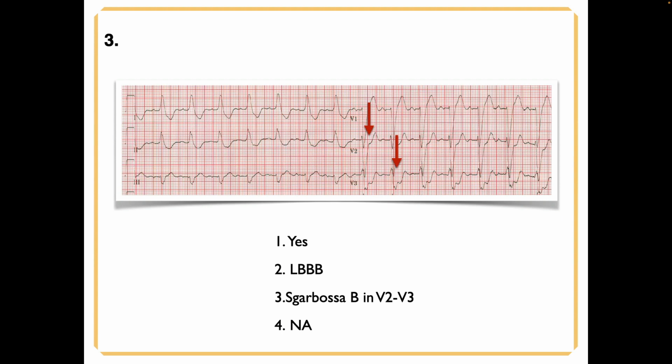I'll double check, because I do have a left bundle that has a little negative thing in V6, and I remember reading a sort of weird explanation of it. I'll check, so it might follow with this one too.